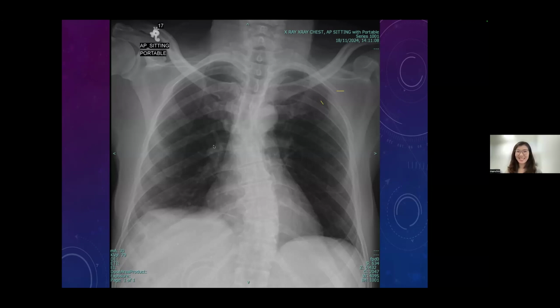Please. Wait, let me see where. Come on, guys. Are you guys looking as well? I'm really looking hard for the first time. Our participants today, are you looking or not? I'm looking hard at the bones now. See who is the fastest to get the correct one.